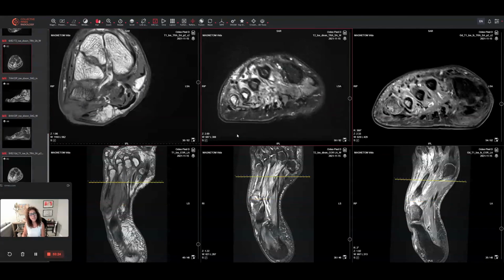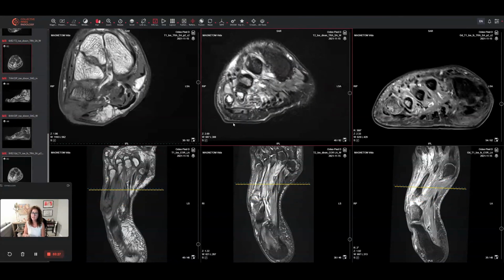So when I look at the different edema patterns, I can have diabetic vasculopathy. That's just bland edema. That's just edema that is non-cellular, like the difference in the cardiac transudate versus an exudate. That's just a bland fluid region that is not infected.